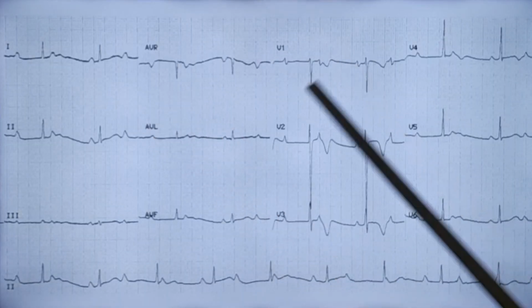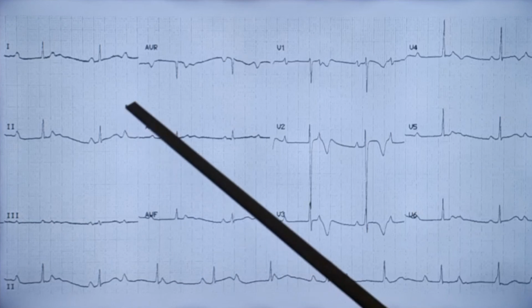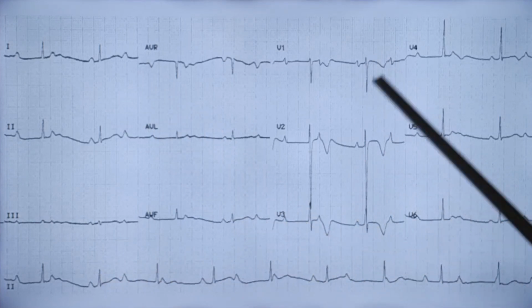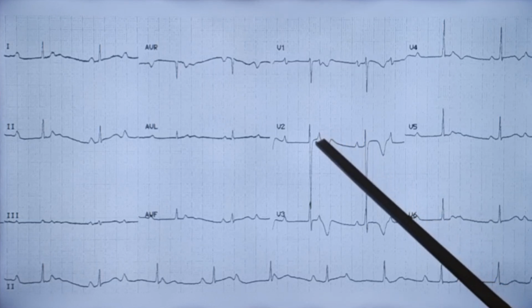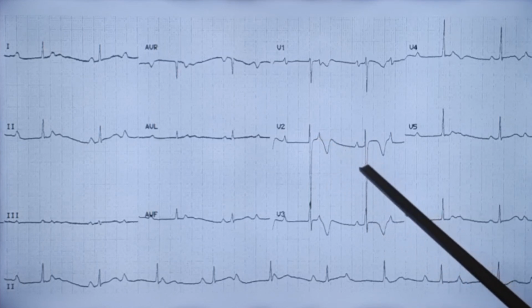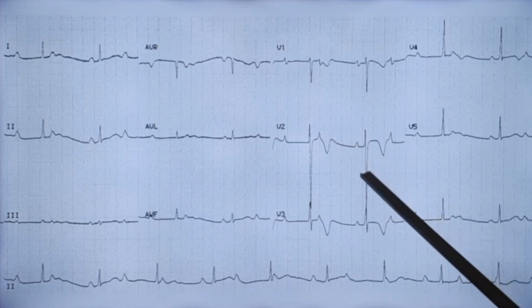If you have a look at this ECG, sometimes in this region you may pass it off as just a low normal heart rate with nothing else. But careful analysis in this region will easily tell you that this is one P wave with a fairly normal PR interval, but you have another P wave here, which is not conducted. So for two P waves, you have one QRS. We might be tempted to think that this is 2:1 AV block.